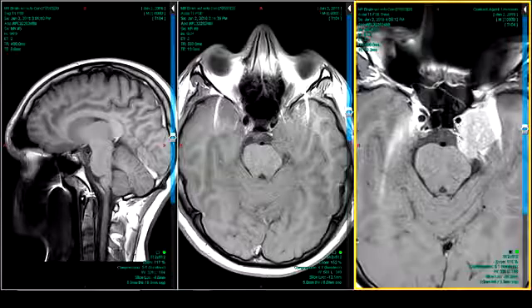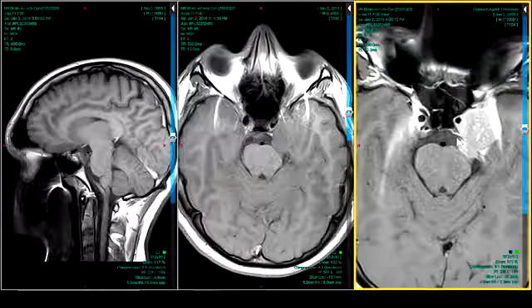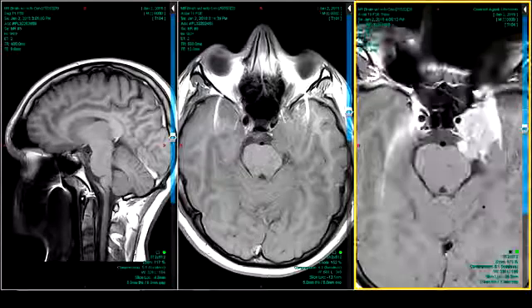That is the crossing compartments kind of thing. And also not a big dural tail, no hyperostosis. So to me, meningiomas, you'd mention it, but I think you're going to be favoring trigeminal schwannoma, this classic figure 8 two-compartment pattern. In terms of the enhancement, it's pretty vascular, but of the two, meningioma is going to be even more vascular than this, probably. It's definitely on average more vascular than schwannomas, consistently.